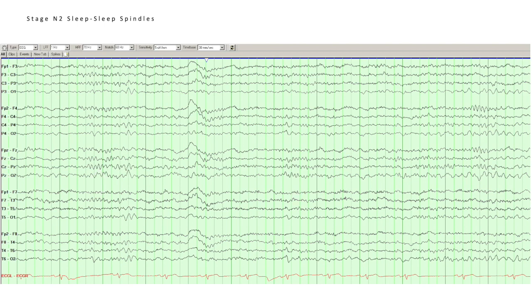Sometimes in older patients, the sleep spindles may appear less well formed, such as this. Notice again, you see them most in the central electrodes. This is a bit different montage than the prior recordings, and here are where the central electrodes are located.